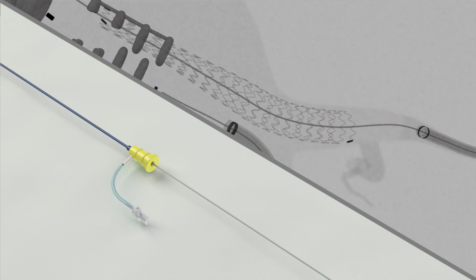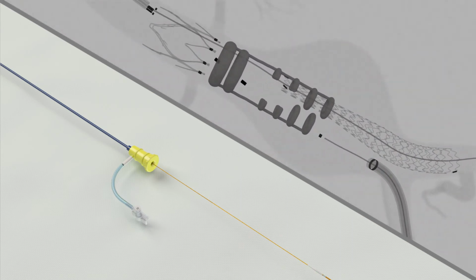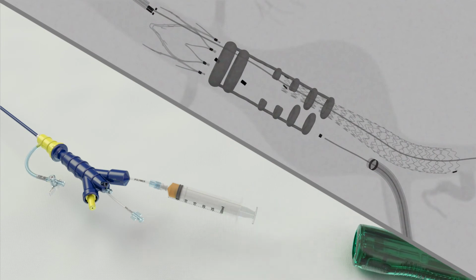The entire system can be repositioned to the desired location. Keeping the guide wire in position, retract the handle to remove the inner catheter from the outer sheath. The delivery system can also be removed completely. A minimum of 14 minutes after mixing the polymer, remove the auto-injector 2.